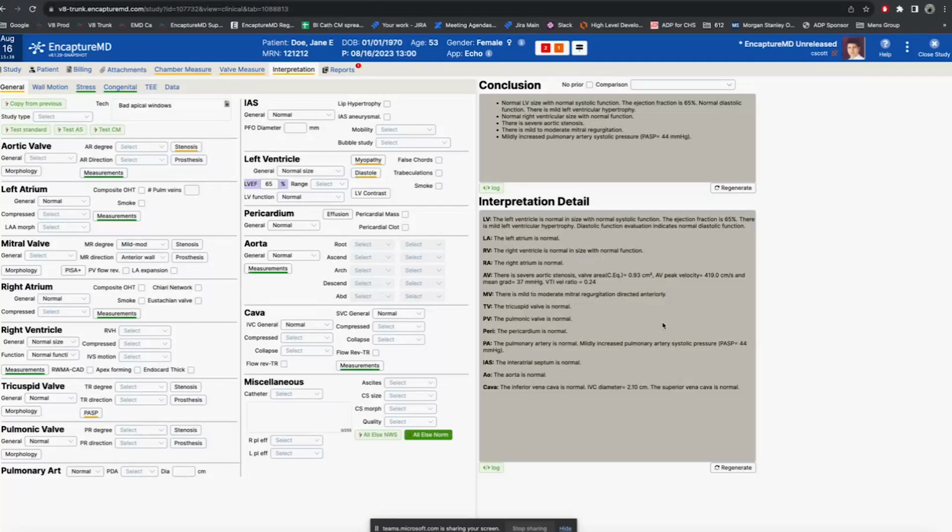And what we find typically is that about a third of all reports are going to be normal or near normal. And so in order to construct a normal report, you're talking about a minute, which is faster than you can dictate, and also much more accurate than any kind of dictation methods for numerous reasons. This report is going to be extremely consistent no matter who reads it. They're having to go through the same user interface, and therefore they construct the same report.